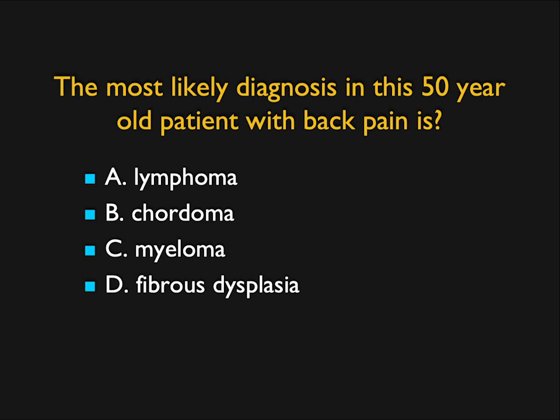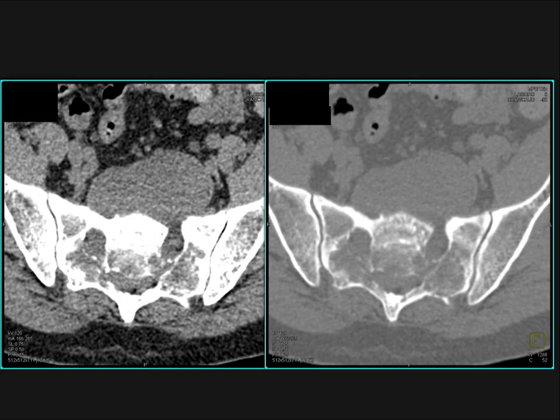This patient had back pain. When you look at the lesion on the soft tissue images, there's a large presacral mass which really extends posteriorly into S1. It's infiltrating. You can see on the bone windows the bony infiltration, the soft tissue mass. Could this be a plasmacytoma? I would consider it, but then the bone would be more expanded. Could it be metastasis? I also would expect more bony destruction.